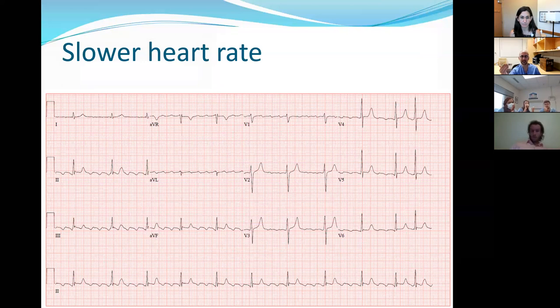Sometimes it is easier to see atrial flutter. I think if I had given you this EKG, we would have had a higher answer rate, because when you have a slower rate, here you have a 4-to-1 flutter, and you look in lead 3, let's say, and you have this negative sawtooth deflection in the inferior leads, and you can see it's constantly going, and the QRS complexes are marching on top of it. This is a much easier thing to see, but not every patient is going to come in having an EKG where it's easy to see, even though we ask them to.